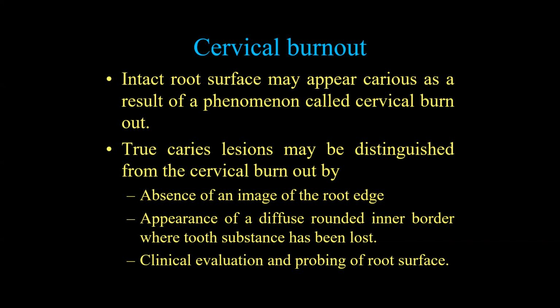This happens due to anatomical variation, like concavity on the posterior teeth, or due to the gap between the enamel and bone covering the root in the anterior region. So due to these anatomical variations, there is differential absorption of X-ray happening in this region, usually the proximal region, and this will mimic a root caries.